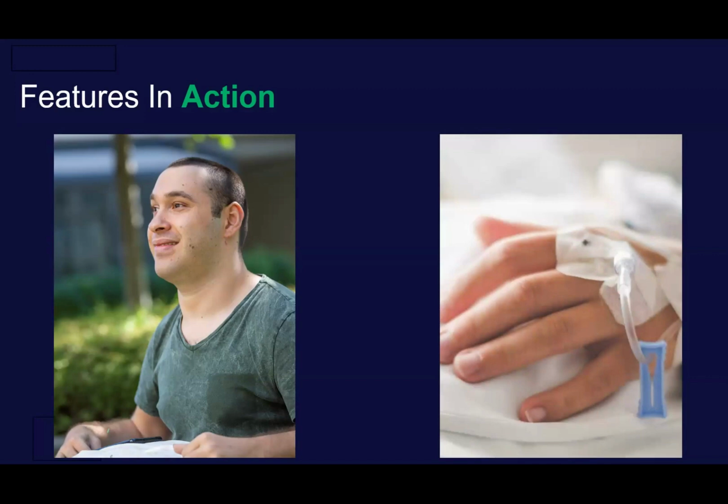Now, for Maria, remember, she's using this in more of an inpatient medical setting. And so she's communicating her basic needs to her care team, supporting her recovery. She's also using the feelings theme so she can tell her children how much she loves them. And then over time, as she starts to regain her strength, she's started typing out unique phrases on the keyboard to express more complex messages.